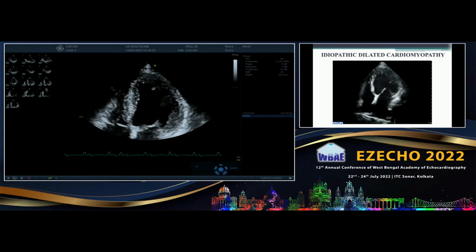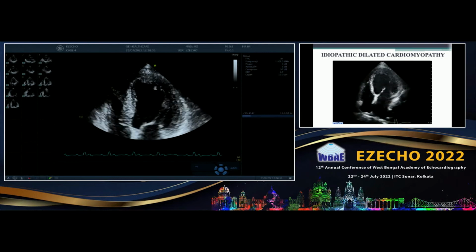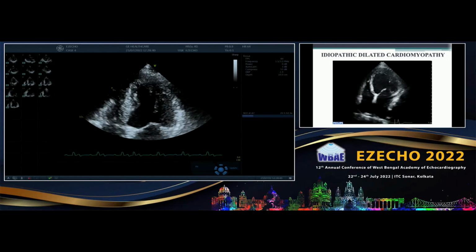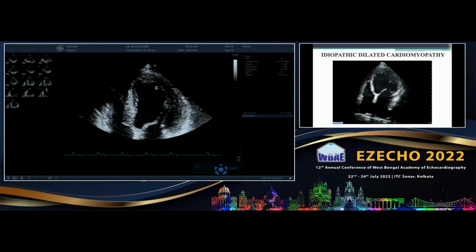So your apical segments are with LAD here, your mid and basal inferior septum is your PDA perforators, and your mid and basal lateral wall comes from your obtuse marginals, correct? This is the only view where you are getting.